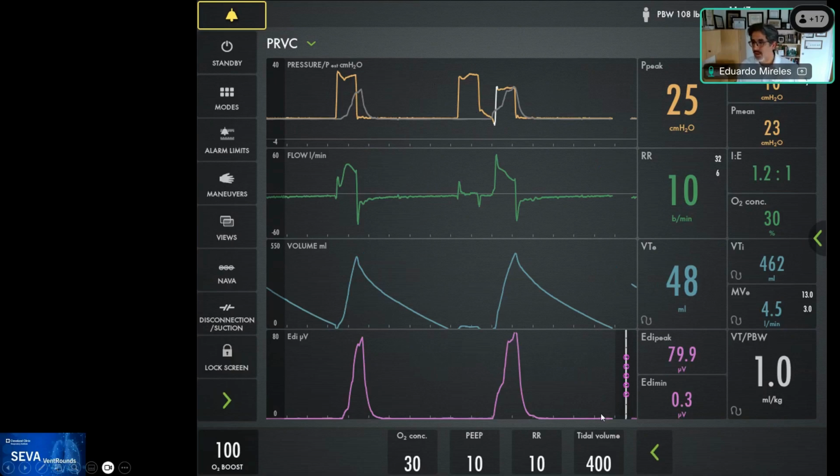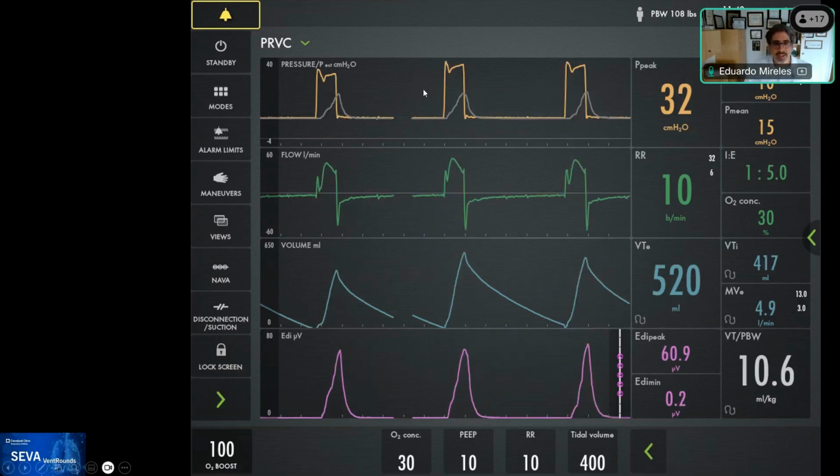And that was to a question about why we don't see the activation of the expiratory muscles. Another important point to see here is the very high EDI on this patient. This patient has very severe obstructive lung disease long-term, and so she consistently has very high EDI values. So here's the other one for you to see.